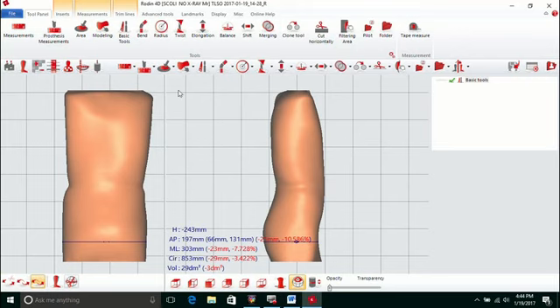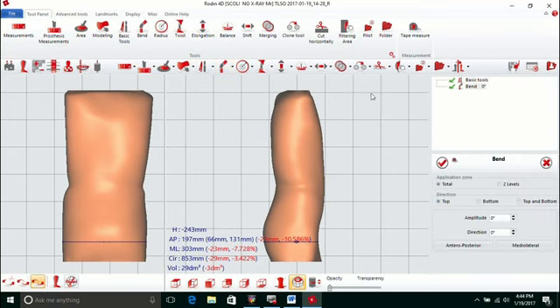We also have, we're going to show you the bend tool. And you'll find some of these tools work very similar to each other as far as how you apply them and how to utilize the amplitude. Now the bend, you have application zone, meaning where would you like it to bend. Right now it's on total. That's like grabbing it by the top and the bottom. Change the selection top and bottom and bending that way.